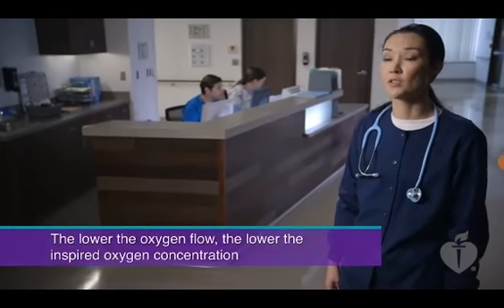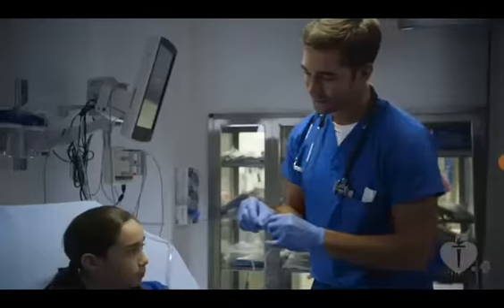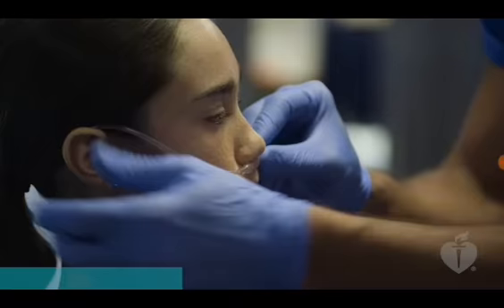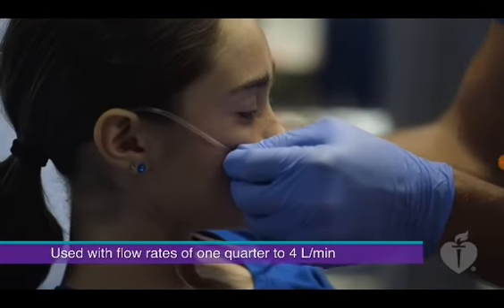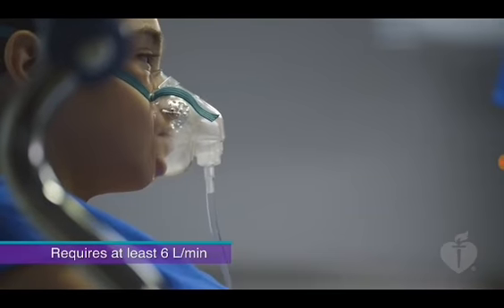With low-flow systems, the lower the oxygen flow, the lower the inspired oxygen concentration. Examples include simple nasal cannula and simple masks. A simple nasal cannula is generally used with flow rates of 1/4 to 4 liters per minute. A simple oxygen mask requires at least 6 liters per minute, but 6 to 10 liters is generally provided.